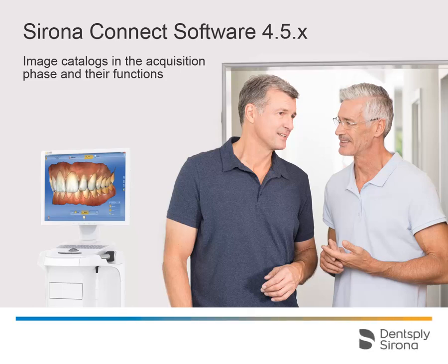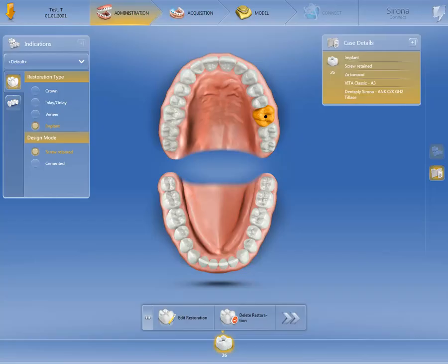Welcome to this video tutorial on the topic of Sirona Connect. In this video, you will get to know the various image catalogs from the acquisition phase, as well as their functions. First of all, let's have a look at how we have set up this case in the administration phase.